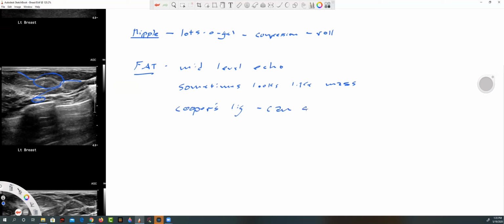They can shadow. And here's the thing about shadows. If you don't know exactly what caused the shadow, it is always suspicious. Shadows deserve a second look. Always deserve a second look.